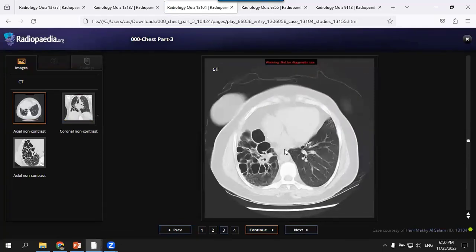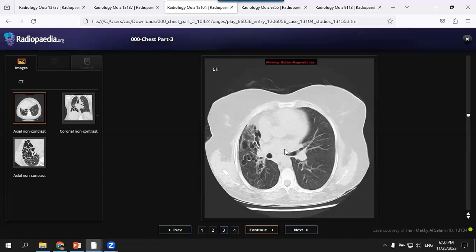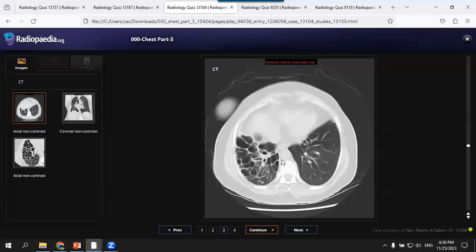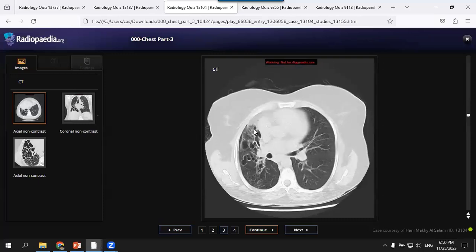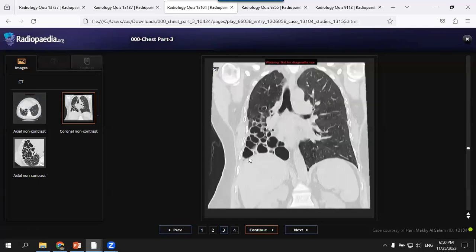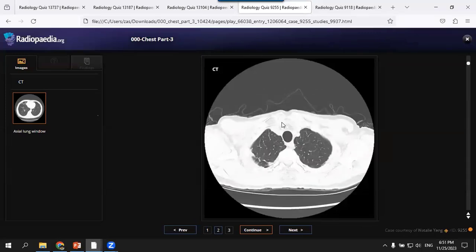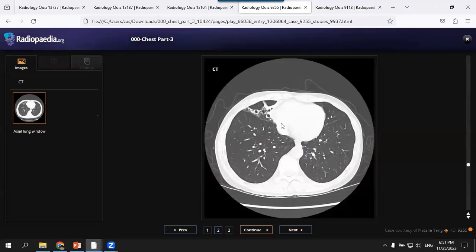So the CT scan confirms the cystic or varicoid bronchiectatic changes affecting the right lower lung zone. No signs of active infection, no tree-in-bud, no fluid layering, or no pneumothorax. This is post-infectious bronchiectasis, which predominantly affects the lower lobe. In chronicity, it has some sort of volume loss. In chest X-ray, it has also some lower lobar affection. What about CT?